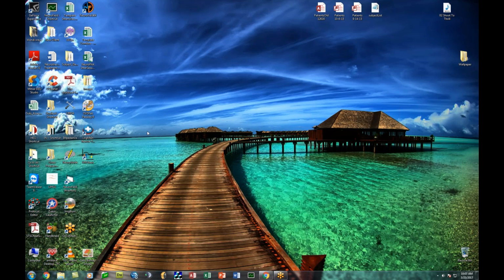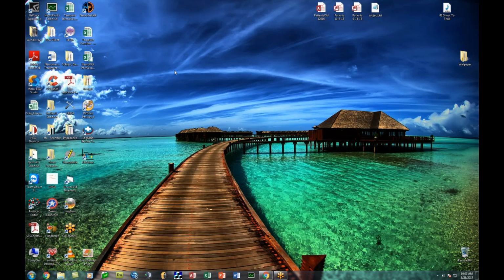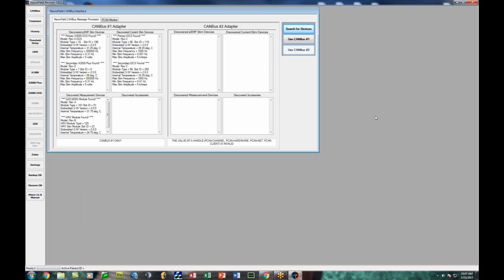So I'm going to start NeuroField64 and take you through the platform. We have a lot of different things that you can do in this particular platform. And what's really great about it is that there's so much functionality in 64 above NeuroField 10 that we're using it now almost all the time.